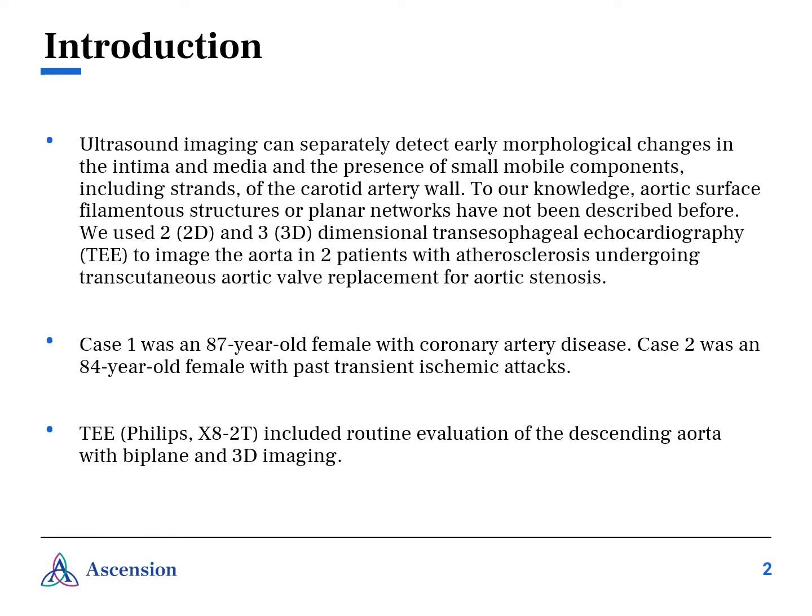Arterial surfaces generally appear static on ultrasound, with exception for gross mobile thrombi and atheromas and dissecting intimal flaps in the aorta and carotid artery. Closer inspection reveals subtle findings of the surface mobility of the arterial surface, such as minute high-frequency motion and fine mobile strands. We previously described mobile carotid strands at the common carotid artery bulb junction on 2D imaging using 10 MHz linear transducers. This experience has prompted us to determine whether arterial strands occur elsewhere.